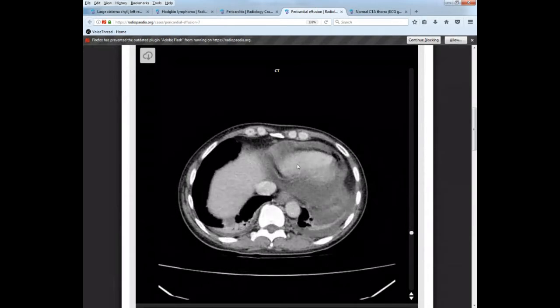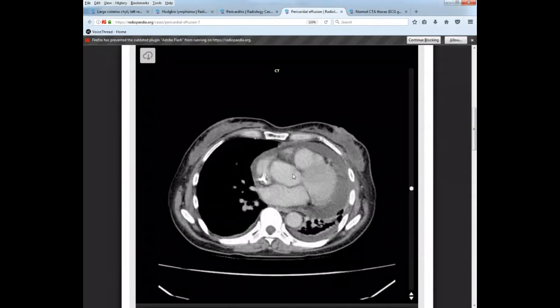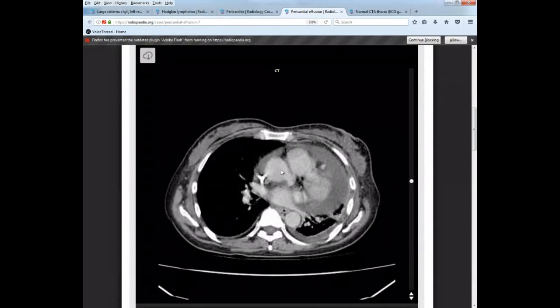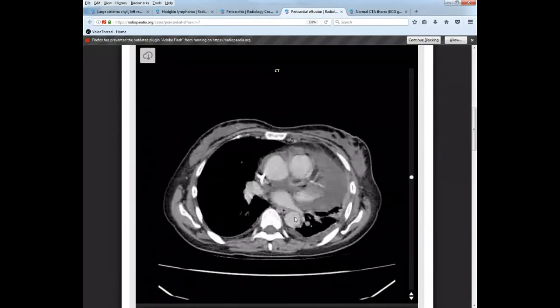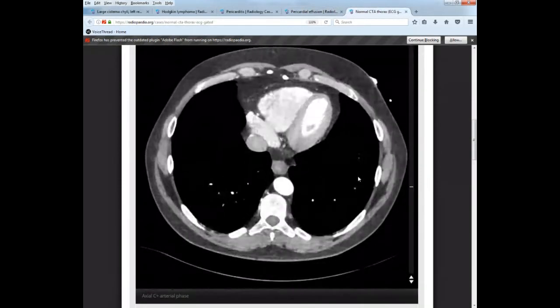Left ventricle is going to become the aortic base right here. Here's where it's pumping out of the left ventricle into the aortic trunk. Ascending aorta right here. Aortic arch right here, and then descending aorta traveling down here. Okay, so there we go. That's our chambers of the heart and cardiac circulation. Our great vessels, let's switch over to a CTA. This should make it a lot easier to see.